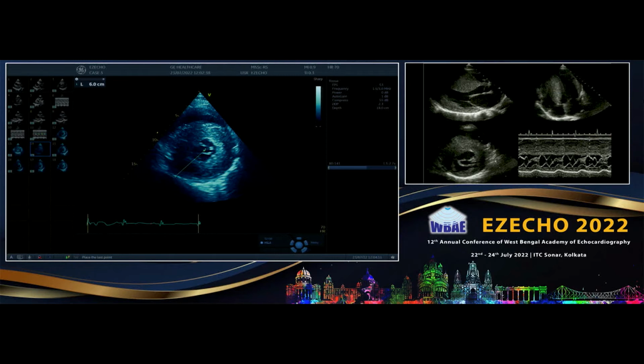And now you measure from endo to epi and look at the thickness, okay? Let us look at the thickness, how much it is. 32, my God. So your focal thickness can be anything. Anything 30 millimeter and above is very thick. And as I told you, the variability is 5 millimeters. So let us go at other places.